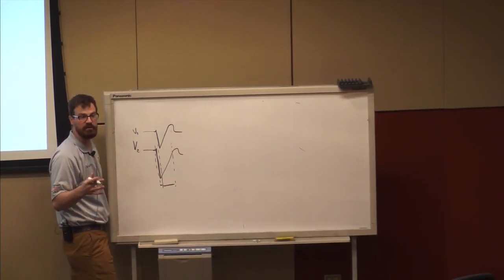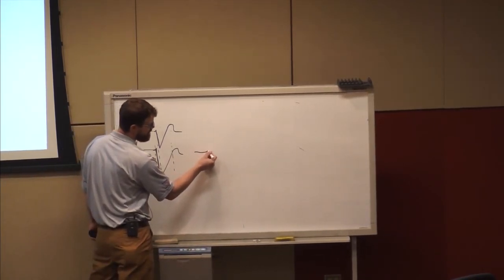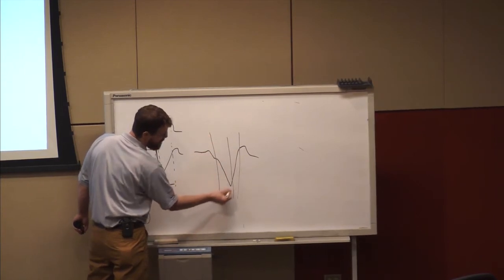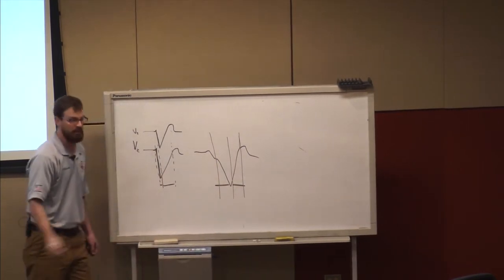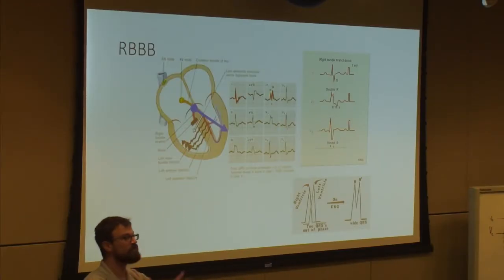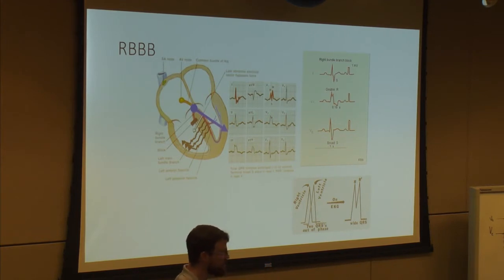But let's take a pure ventricular beat, like a PVC or a run of VTAC, then what does that look like? Well, I typically have this slow notched down slope followed by a slow up slope. So when I split my event, it's slow on both sides. Does that make sense? So I'm only half slow with my bundle branch blocks, and you can tell that through your intrinsicoid deflection as opposed to slow throughout, which tells me I've got a more pathologic state than just the bundle branch block. So that intrinsicoid deflection can tell you a lot about what you're dealing with.